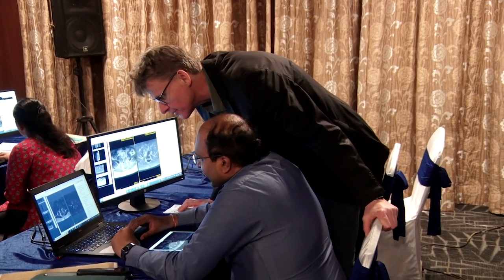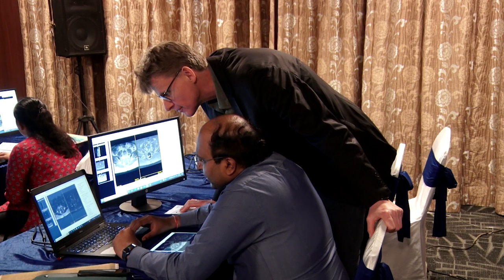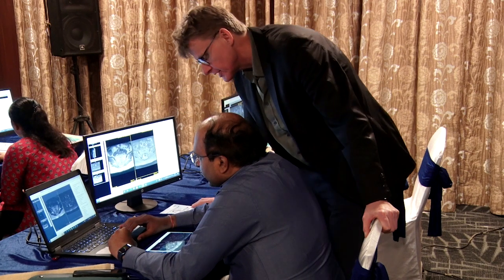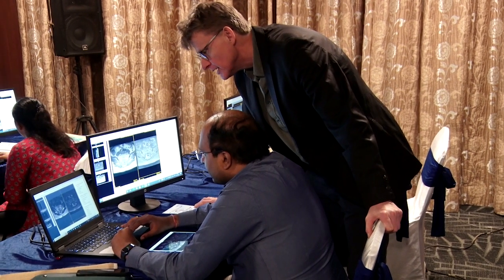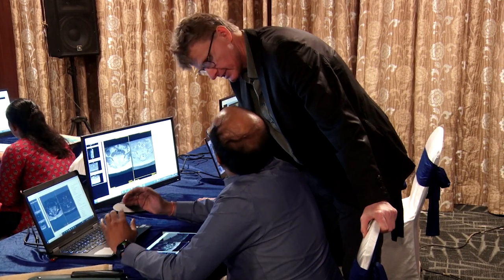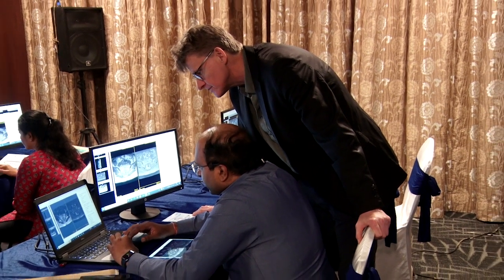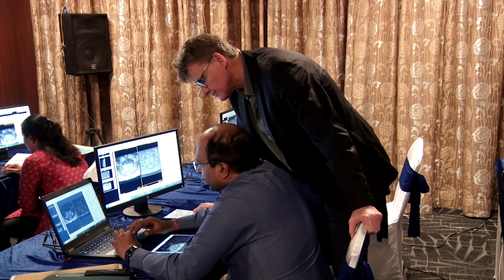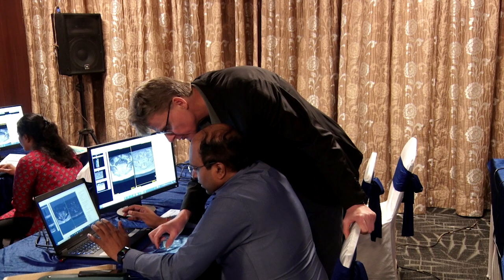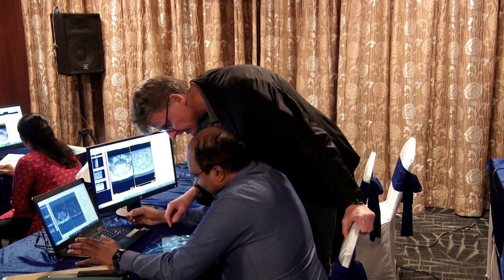So where is it located? Here or in the sector? It's an upper part more, more anterior. Yeah, I agree. Okay, I try to do this. It works. This is much better. Okay, so you need a mouse.